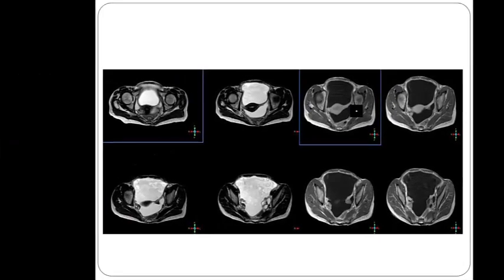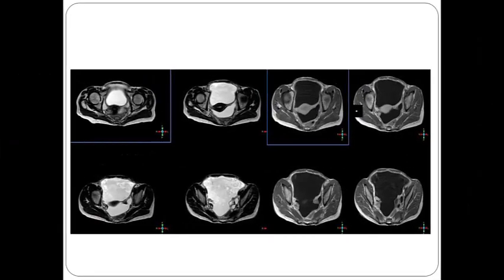A finding also is that in Krukenberg, usually there is ascites. If there is no ascites and you find two lesions, sometimes colonic, as we see in the first case, where we have an ovarian lesion and a colonic lesion but no ascites at all, and the ovarian lesion has a benign nature, you should think that it may not be Krukenberg tumor.